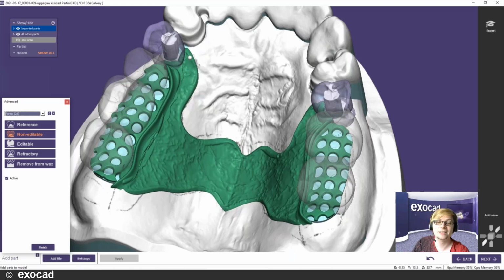A short technical explanation, since the software is not based on STLs, but on voxels, meaning like cubic pixels, like just cubes stacked on top. It's a different type of surface generation. So if I wanted to import STLs and wanted to change them here in the software, I would have to change those STLs to voxels, meaning the surface information might be lost.